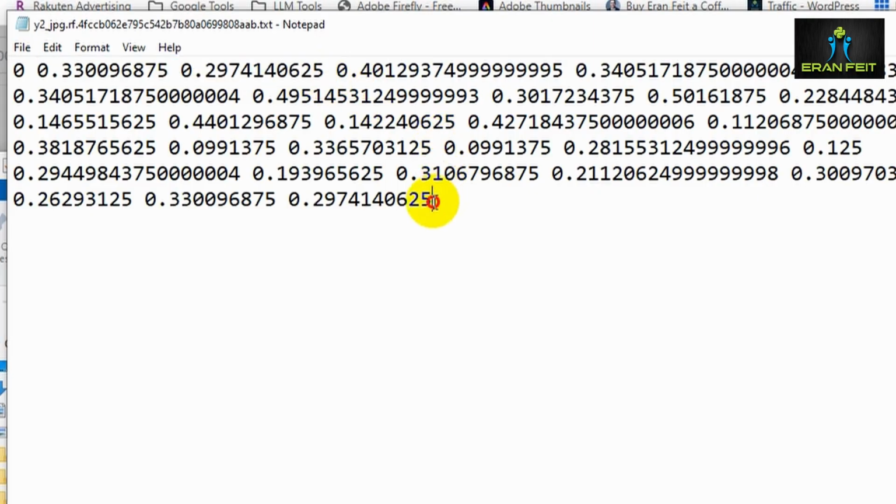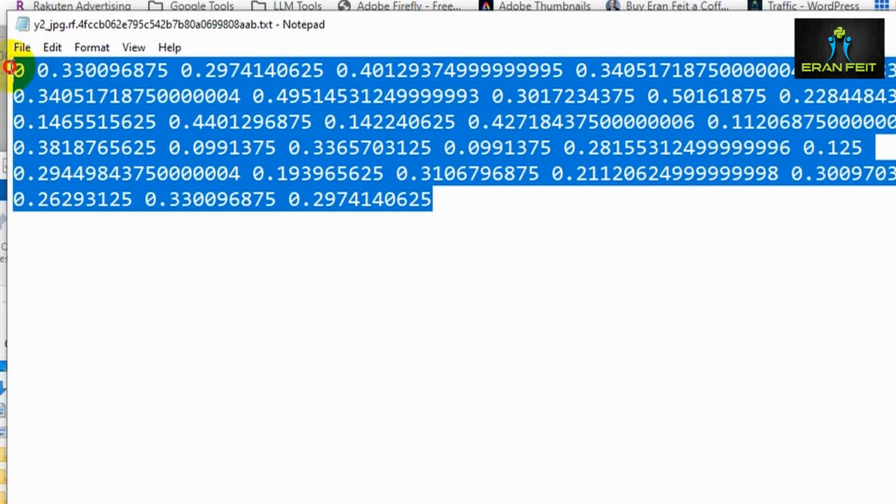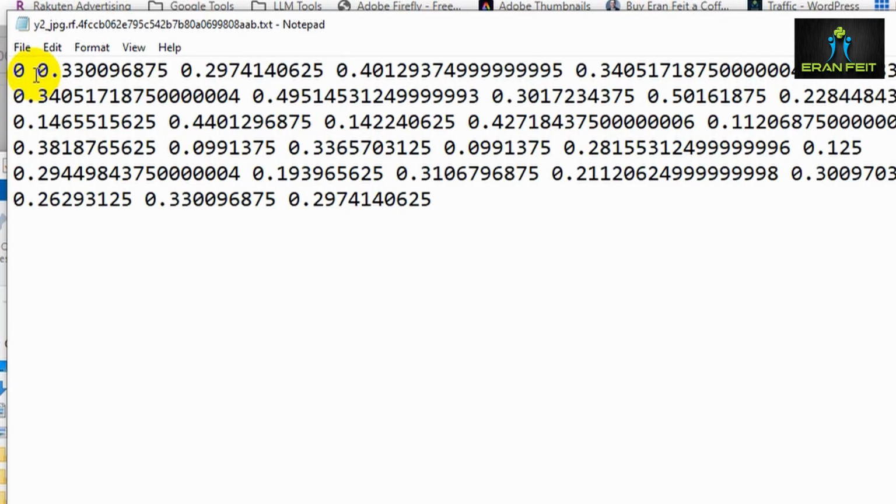If we have one tumor, you will basically get one line, it's just fragmented. But if we have more than one tumor in the same image, once again we will have the character 0 and a bunch of numbers that mark the second tumor. So for example, this file indicates a tumor in one image.